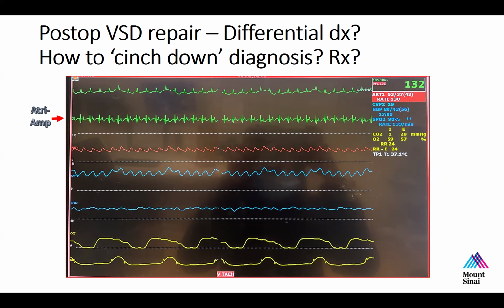And what's happening in the AV node then, if there is an A following every QRS? If you're correct that this is VT, and I'm not saying you're not, but if it is, how do you explain the fact that there is an A following every QRS? I guess by the time the ventricular rhythm is generated, and by the time the refractory period is over, maybe there's a P wave which is conducting, which is leading to atrial depolarization.